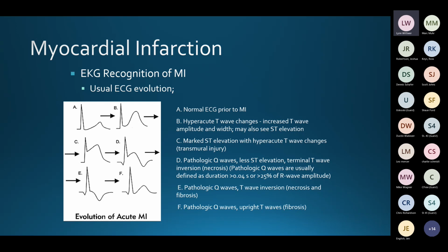So our whole point of identifying the ST segment elevation myocardial infarctions is to get persons to the cath lab and get the culprit vessel opened with a catheter and a balloon dilator, and then to stent this usually, so that we don't get to this point.